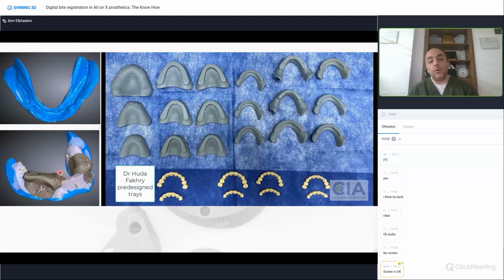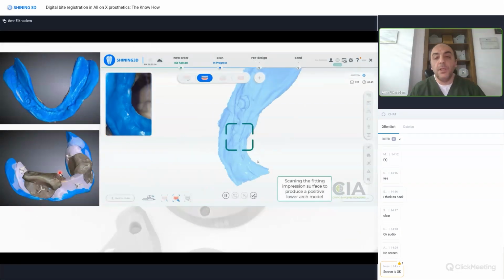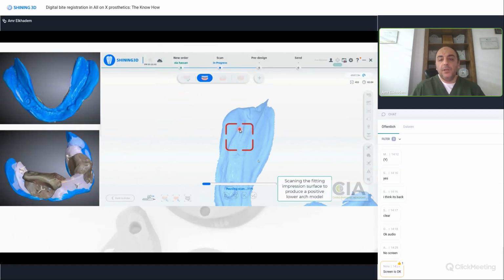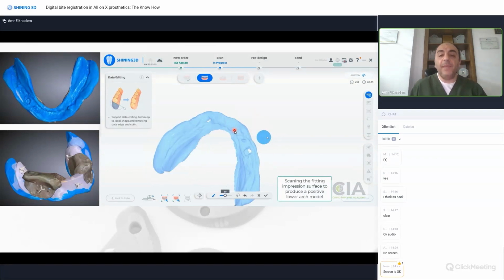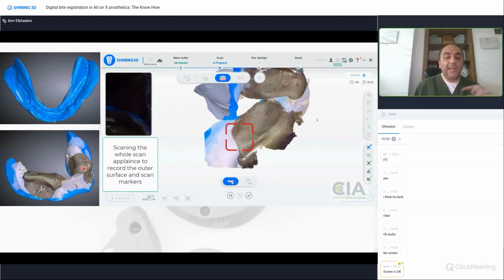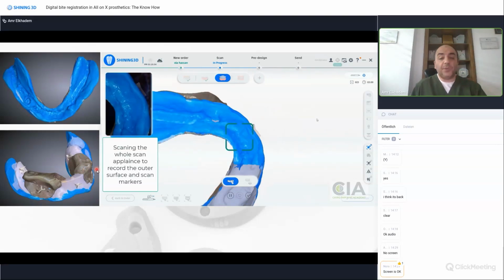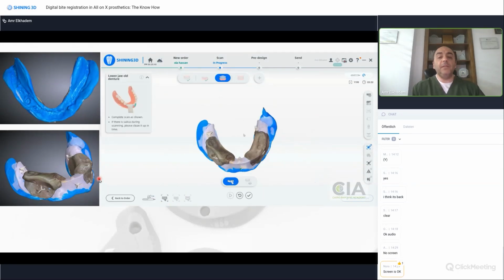Sometimes when we're preparing our patients for a denture or maybe doing an implant-supported restoration, we take a tray and we make an impression and we scan the impression. When we scan the impression, the software has the potential to just invert the scan and make a positive model for the work. So now I'm having a model, and then I put my green stick compound maybe bilaterally and take my jaw relationship, and I scan the whole assembly, the tray with the compounds as one piece, and the software can align both of them together.